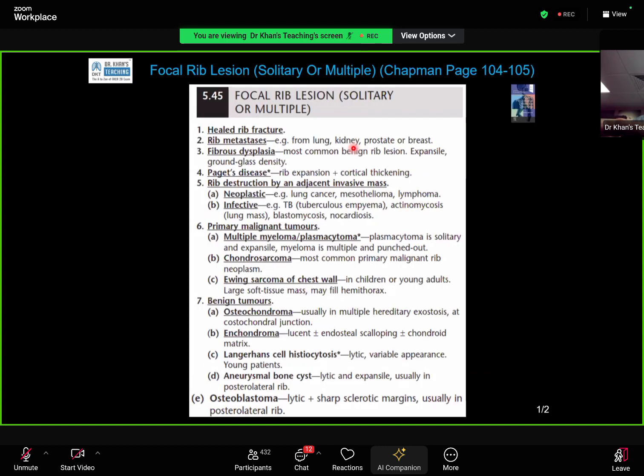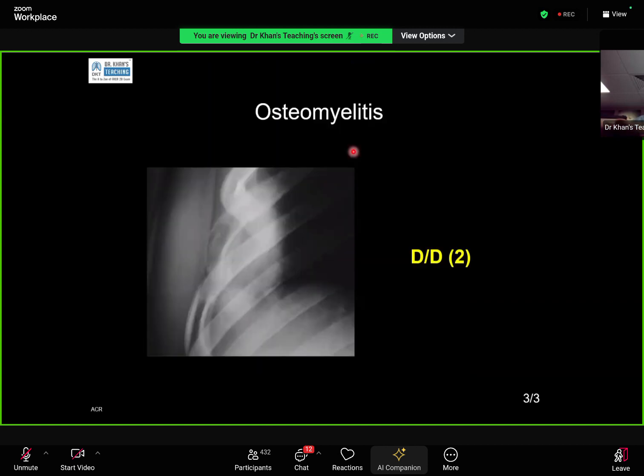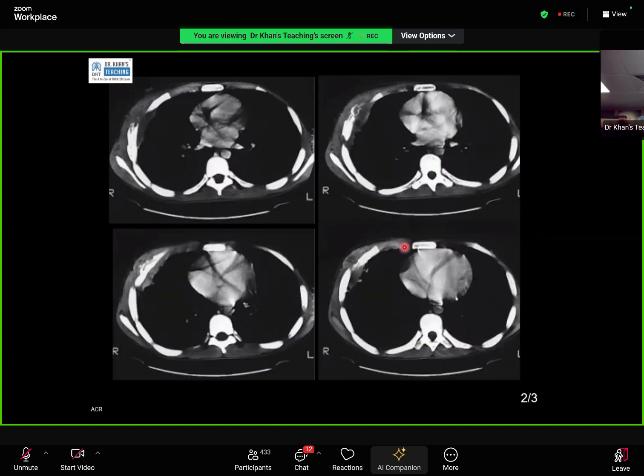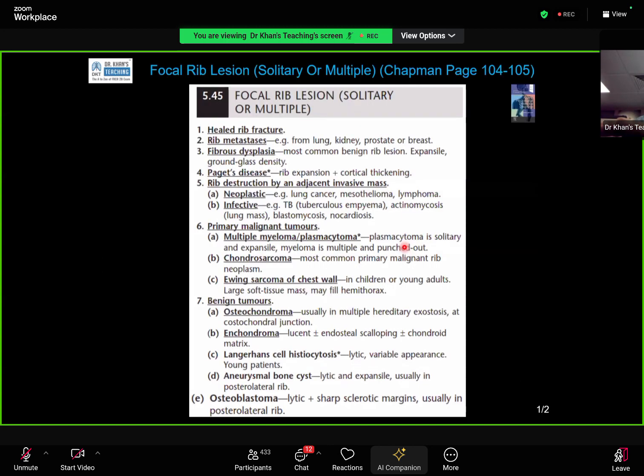But this is not at all enchondroma. Enchondroma is not an aggressive appearance. It will not cause this destruction. Ewing's, by the way, in flat bones is more common. You apparently have this concept that it is more common in long bones and not in flat bones or the axial skeleton. That is not true.